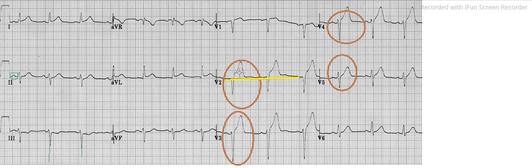And here you see the difference. So you see that the ST segment has been elevated and the T wave is upright. So you basically see this morphology especially in case of MI.